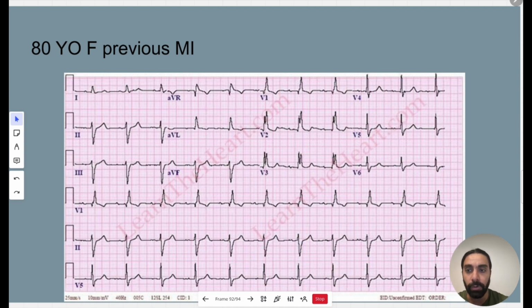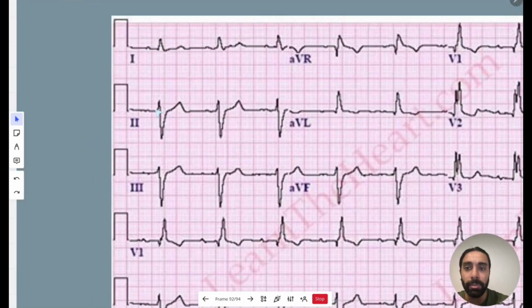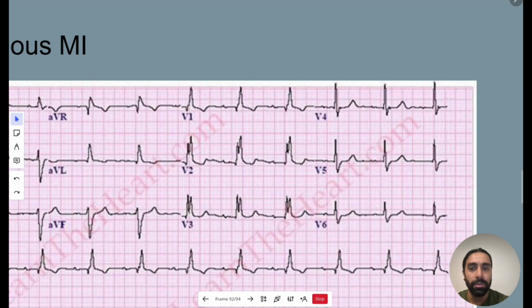So far so good. Lead 1 is positive and aVF is negative, so we have a left axis deviation on this patient. And we're starting to see the QRS widen, so you see this positive R and then this pretty deep S wave. Same thing with lead 3, positive R and a deep S wave and prolonged QRS. You also see V1 is positive. Remember, it's not supposed to be positive or predominantly positive. Same thing with aVR, you see predominantly positive here.